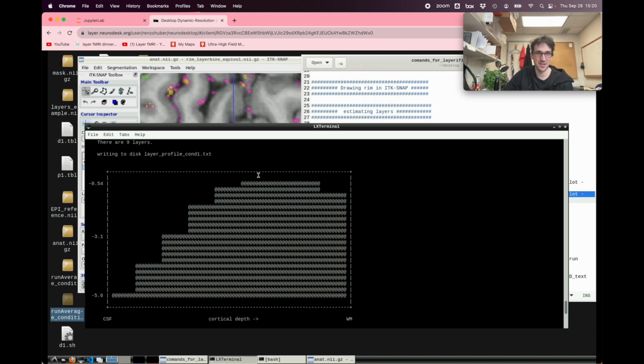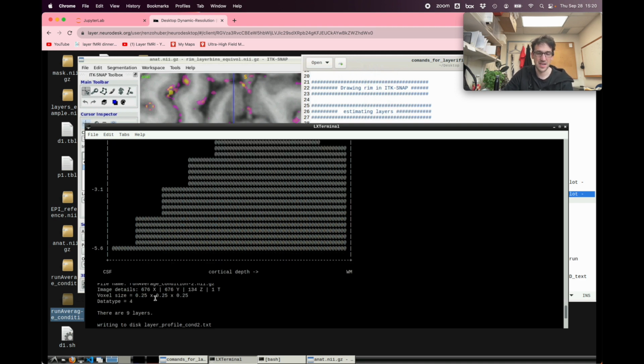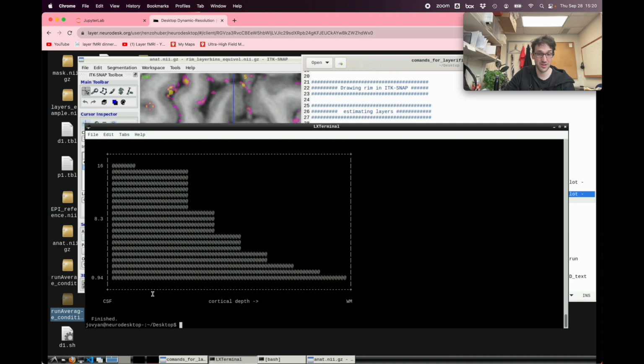So it's even a bit concave here. It's really dominated from the surface. This is usually not as bad for the positive condition, where you have this kind of weaker slope. The most superficial layer is not really dominating it that much. It's still the strongest, but it's not as extreme.